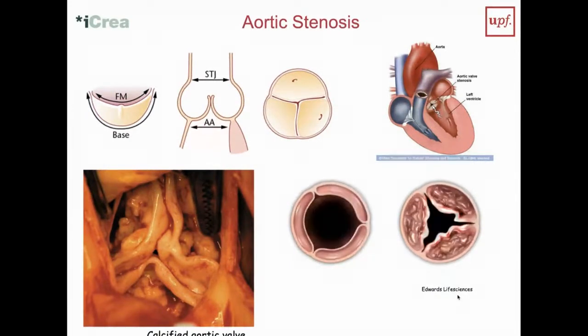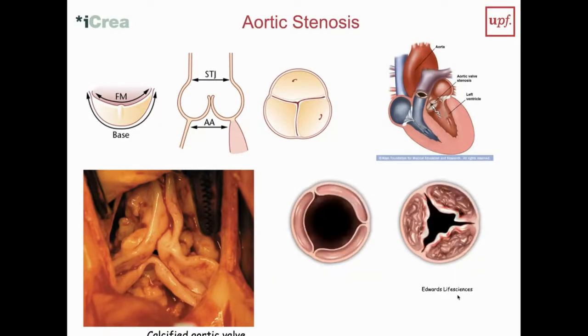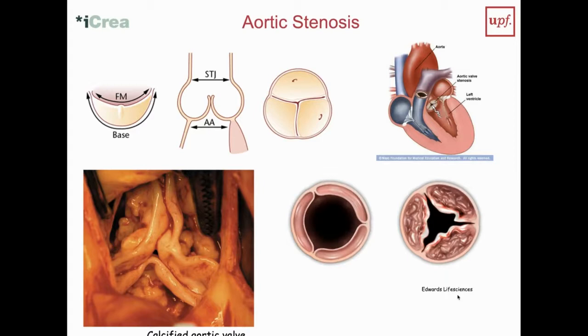Okay, besides looking at the coronaries and coronary artery disease, we can also use CT for some other things. And one of the things where it's being used currently is to help guide treatment of some valvular problems. What you see here is an aortic valve. So that's the valve between the ventricle and the aorta, the one going towards the aorta. It has to open when the pressure is high. So when the ventricle's pressure is high, the blood should go through the aortic valve into the aorta, and the aortic valve should open in such a way that it's a very wide opening.